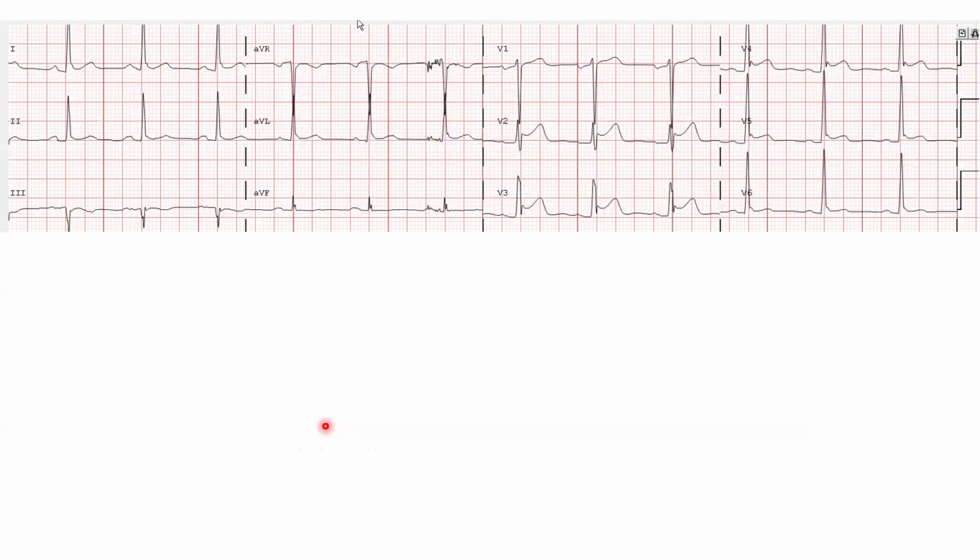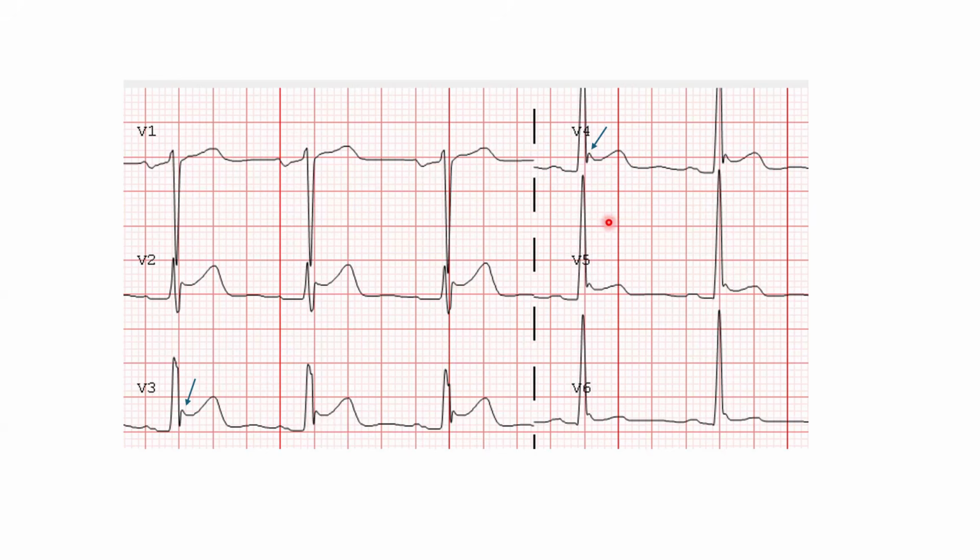And indeed, in this patient, this is his full EKG. This was early repolarization, and this was based on the fact that he had the same EKG a couple of years ago. He also had negative serial troponin. And note that with early repolarization, ST elevation is usually not that high, but it can be up to 3 millimeters, particularly in younger men or men who are athletes or African Americans.